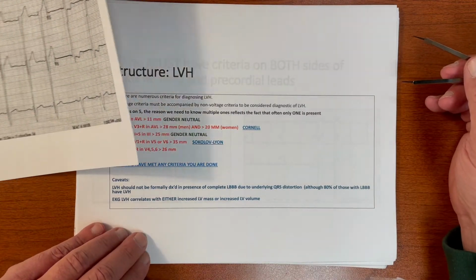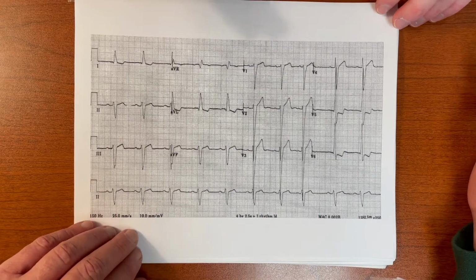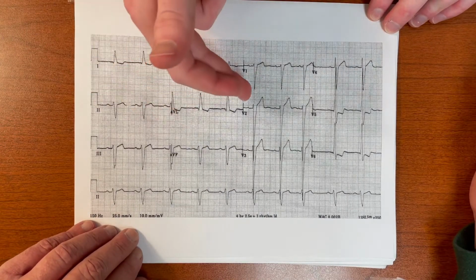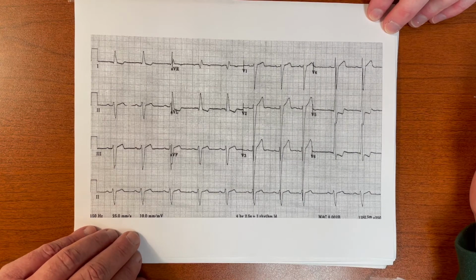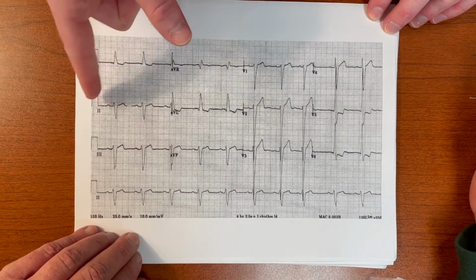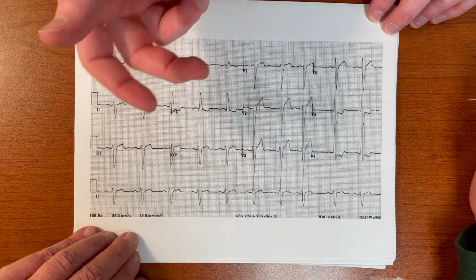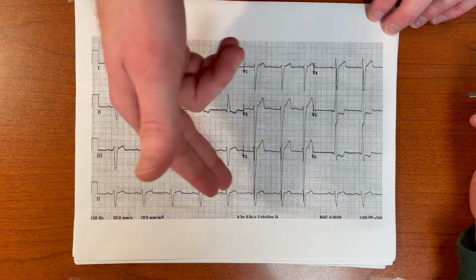I have a question. When you're looking at an EKG like this, I've seen some like this on the wards where there's massive LVH and the QRSs are just really interfering with each other. Is this a good time where you might want to redo the EKG or recalibrate it with these boxes to get it separate? Like if you cut the voltage standardization in half, can you do that?